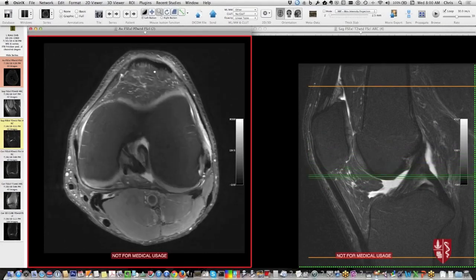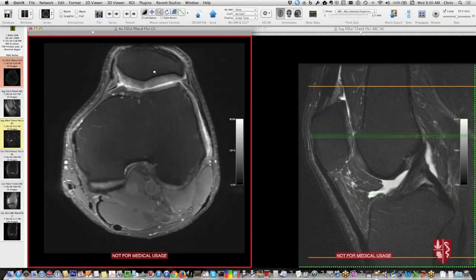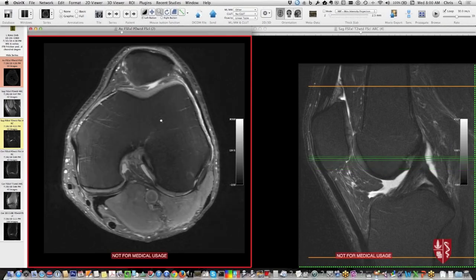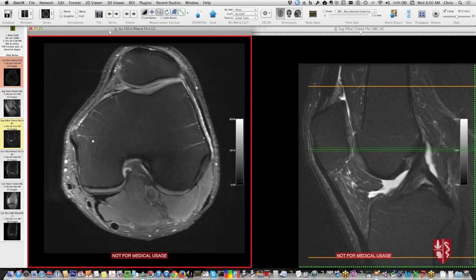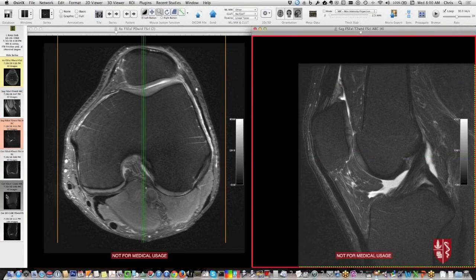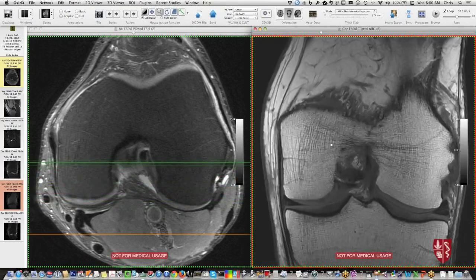the patellar tendon and quadriceps tendon in axial. And then there's a number of other things one can check, okay? We'll look at some other examples here in a minute, but things like the medial collateral ligament. So here we are medially. This is the MCL here, and notice that it's kind of a broad band coming from the femur. Let me switch this one back to coronal here. Find that MCL.